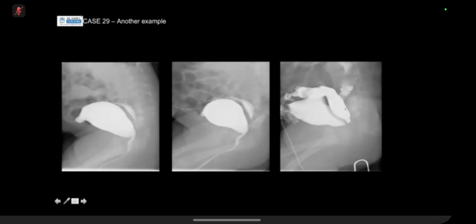And then we've done the distal loopogram, and although we can't see the rest of the things, such as the distance from the perineum, so this is our marker on the perineum to show the gap, although we can't see the connection when we do the distal loopogram, we are seeing that the bladder and the rectum are beaking towards each other, suggesting that there is a fistulous connection there.